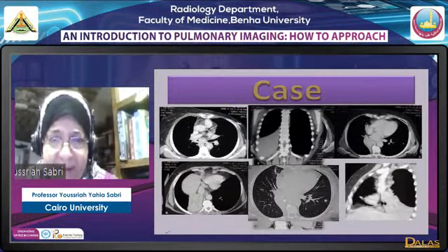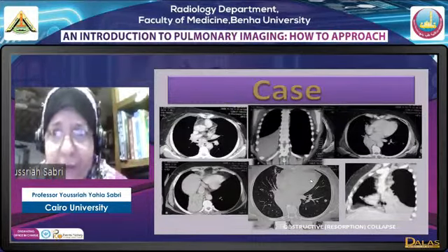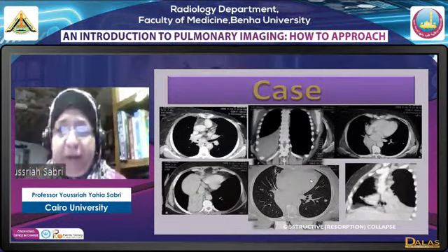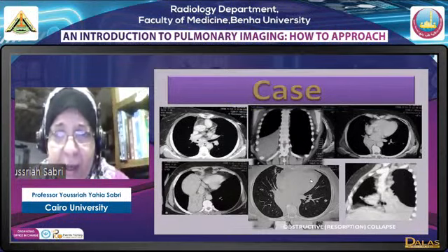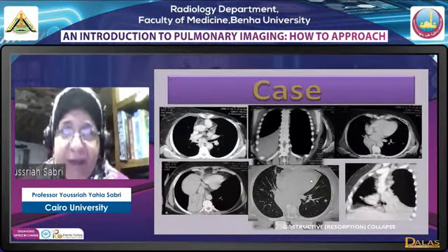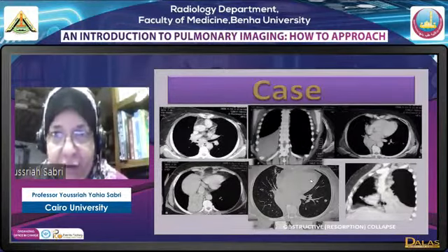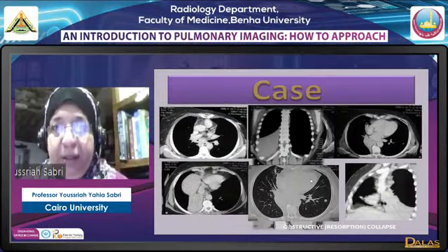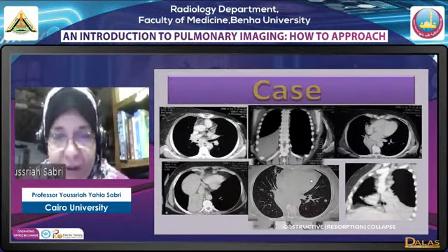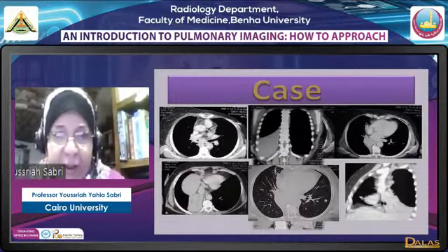And there are also metastases elsewhere in the lung. Obstructive or resorptive collapse. So now we have seen cicatricial collapse due to fibrosis, and it has a very significant, a very special pattern. And we have seen the relaxation collapse, where there is massive pneumothorax, massive effusion, or something causing compression and relaxation of the lung. And we diagnose it by that the effusion is the hero, because we see shift of the mediastinum. Then the obstructive collapse or the resorptive collapse.